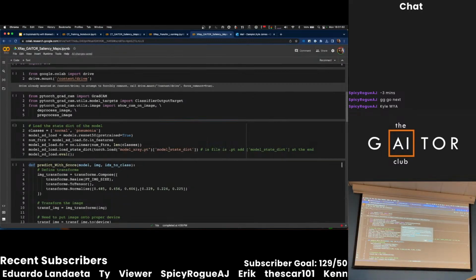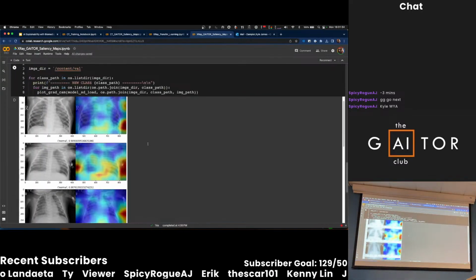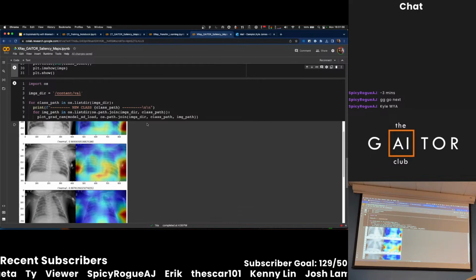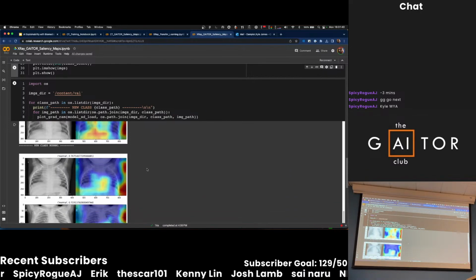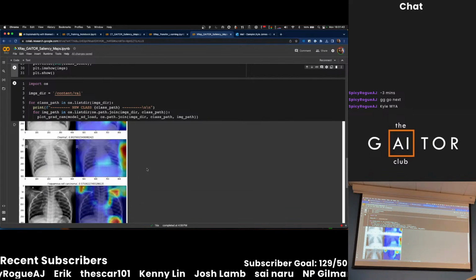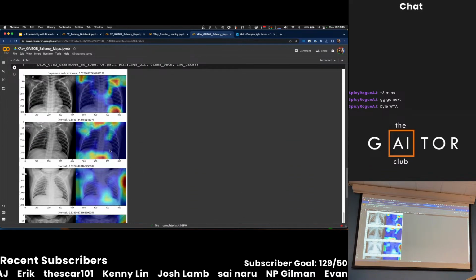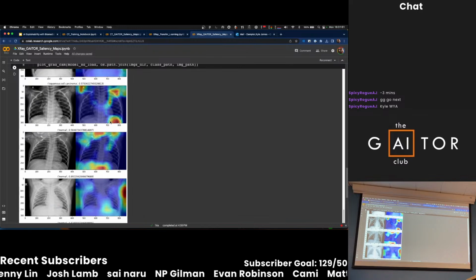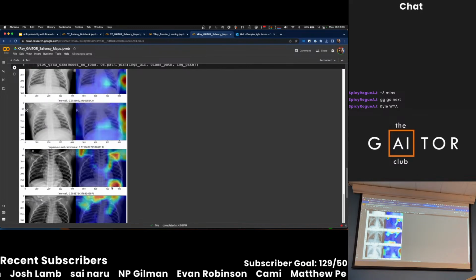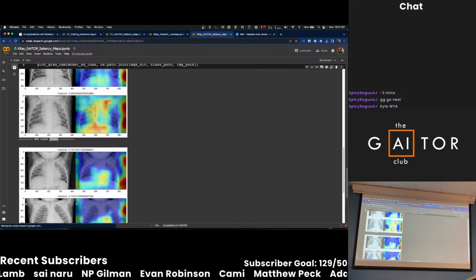Arms as the entire code runs. Yeah, so this is the result. You see how all of them are on that right side, except for these, but these came back. So this one actually came back as the correct result, and it has more in the lungs, right? So everything past this should be class normal.